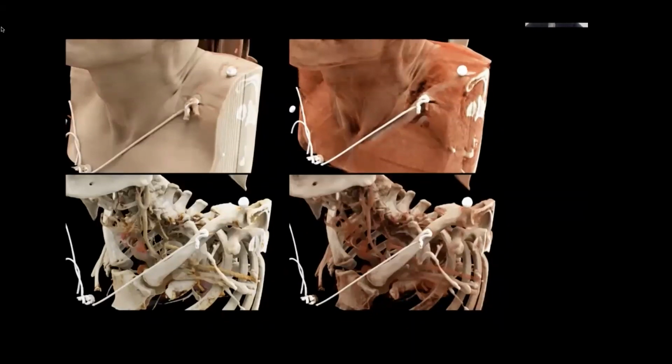Even in a simple CT scan, looking at an axial slice, you're looking at a depiction of what we call a sinogram, and the attenuation values are rendered adjacent to one another in a certain format based on what the barriers of the tissue look like. But we know now, after several decades of using that type of imaging, that these are reliable, because you see the CT, you go to the OR, and you don't get a big surprise, right?